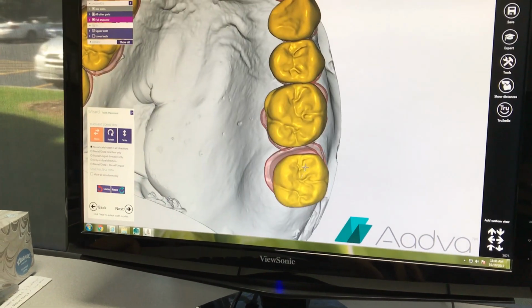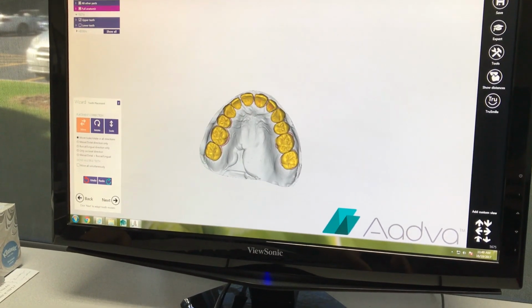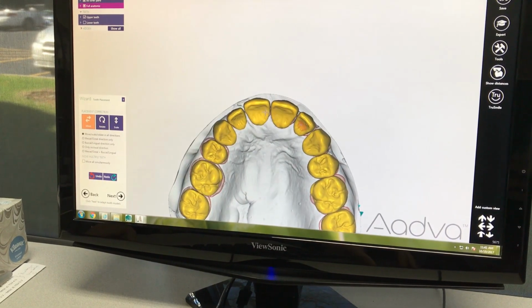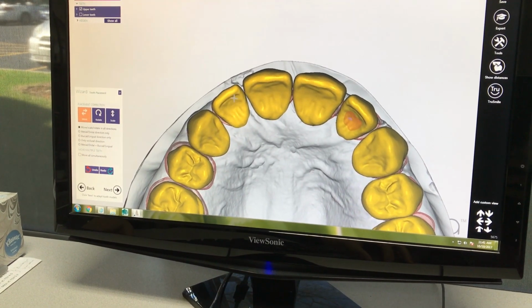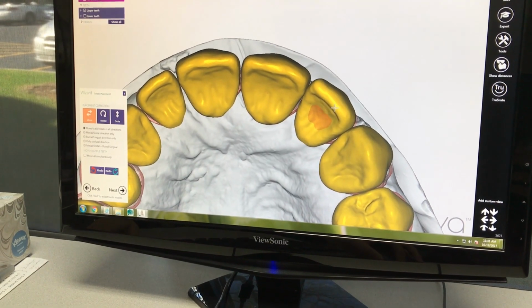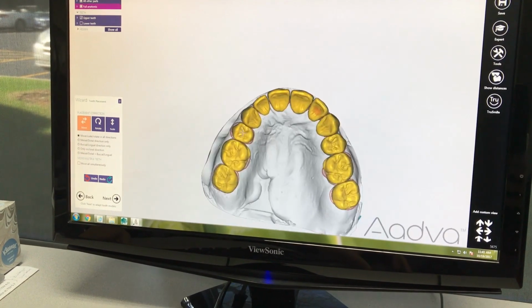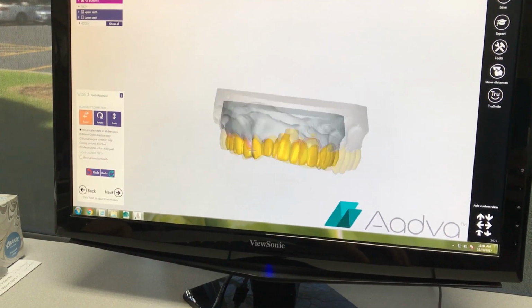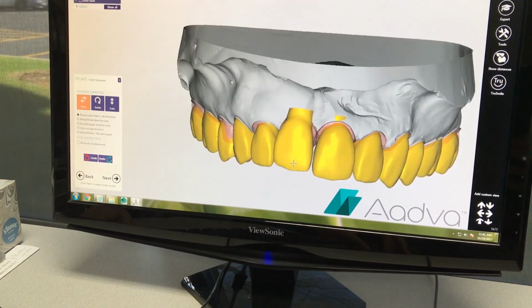It's all about getting the right proportions, getting a good balance between the spaces between the teeth. It's basically like mounting a denture, right? But digital wise, you gotta know how to use your mouse and keyboard. Making it look good, making sure that everything falls right.